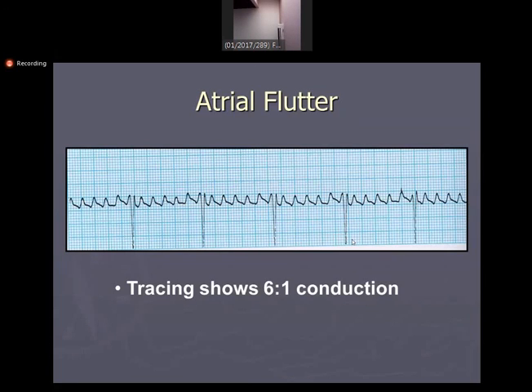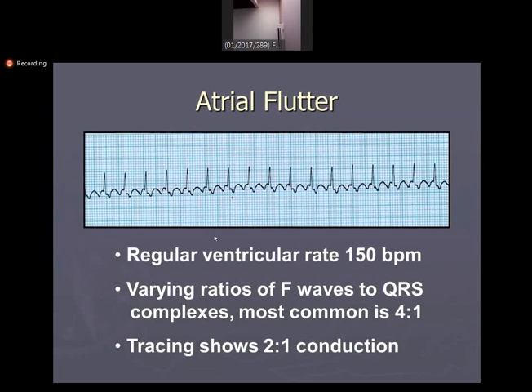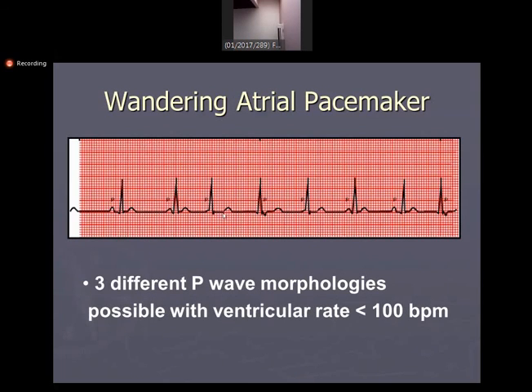Nida Ali, please explain segment and interval again. Yes, I will, because it is a very basic thing. If you see this ECG, any complex or wave which is joined to the other wave or complex, for example this QRS complex S, or this T wave.